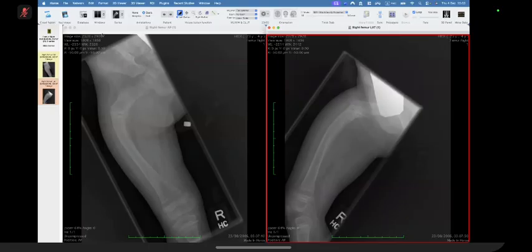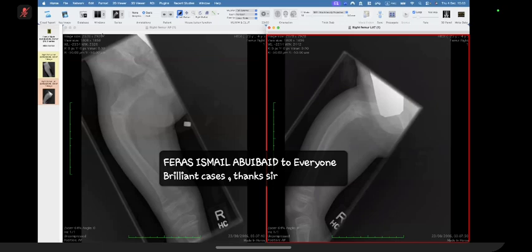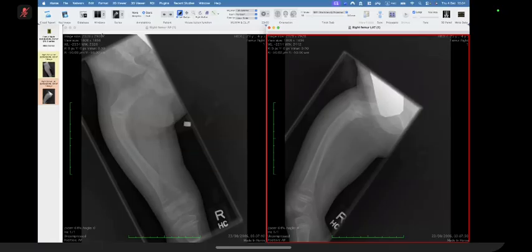To me, the bone density in this particular radiograph appears to be slightly reduced. However, I would confirm this finding by comparing it with the other radiographs of the patient as well, if available. I'll correlate my findings with any given history. If the patient has a known bone disease, my top differential would be osteogenesis imperfecta presenting with fracture. In that case, I would be evaluating the rest of the bones as well, because the patient might have other fractures as well.